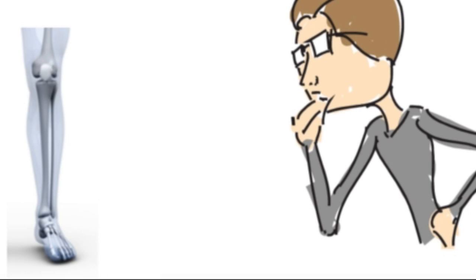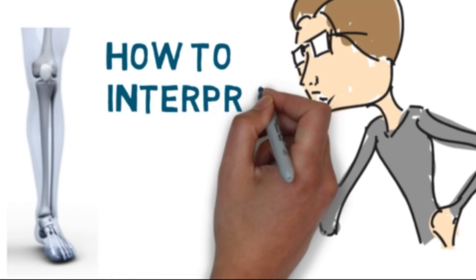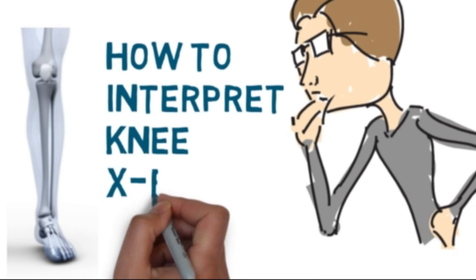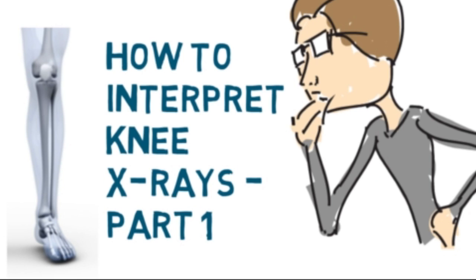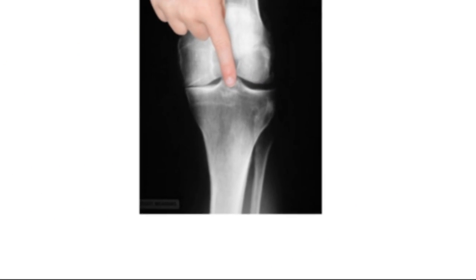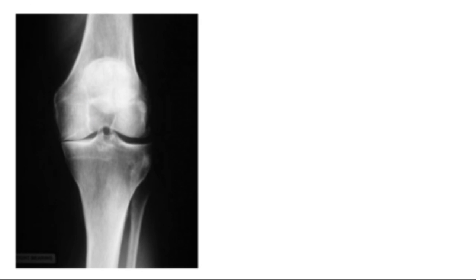This is the first part of a 4-part series on how to interpret knee X-rays. A lot of patients are given their X-rays and they take them home, and they have the report available perhaps, but won't necessarily know the anatomy or be able to interpret the different planes of the tissues through which the X-rays are passing. So we'll go through these different steps slowly, and you'll be able to understand a lot better by the end of this series.